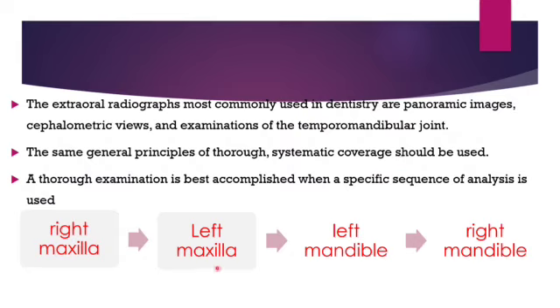That is, you need to start analyzing the right maxilla, then the left maxilla, then the left mandible, and then finish with looking into the right mandible.